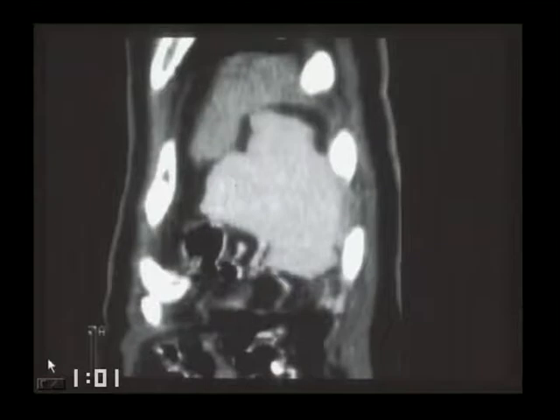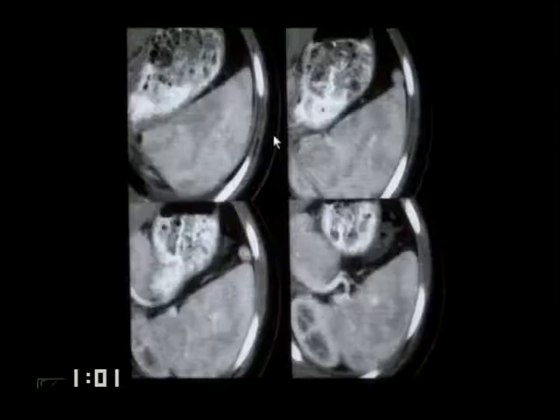This is just a sagittal image to remind us about the normal variation in the lobulation and contour of the spleen, something you don't necessarily appreciate on axial images. You realize the lobulation of what's called the medial pole of the spleen, but sometimes I've seen lobulation on the superior aspect of the spleen like this. Or sometimes you see little things that you want to call accessory spleens, but they're not, because they're actually connected to the main body of the spleen, so they're a splenic bud.